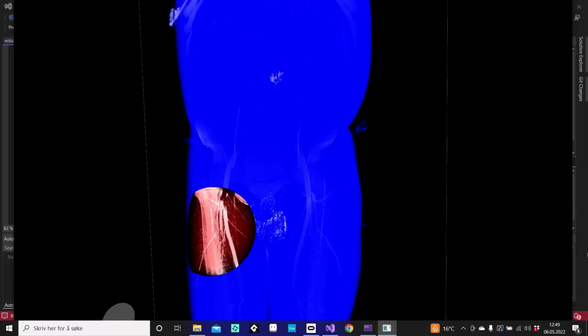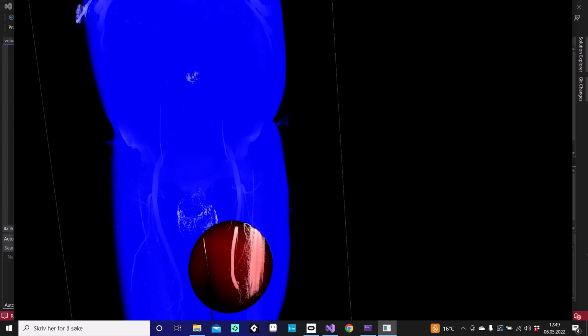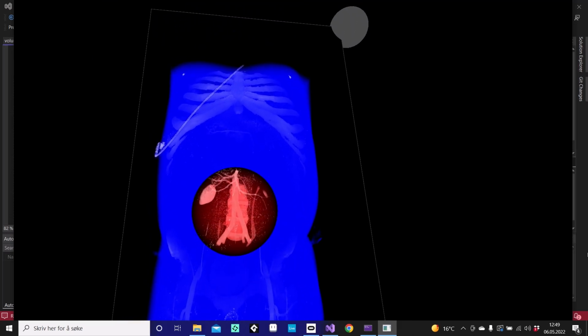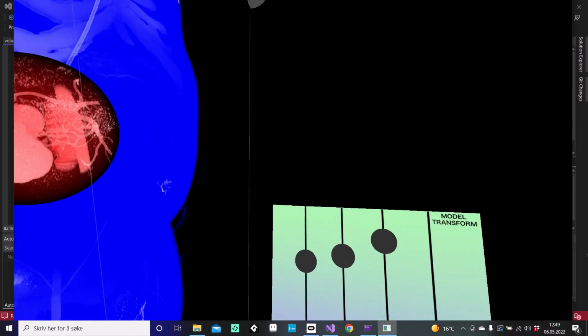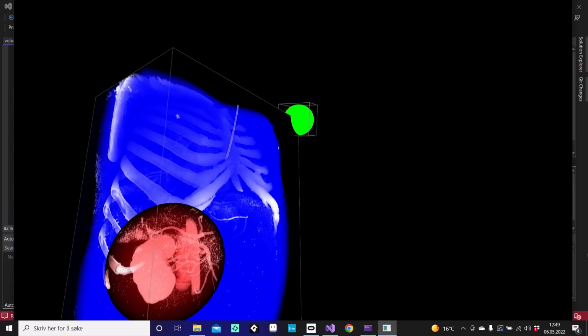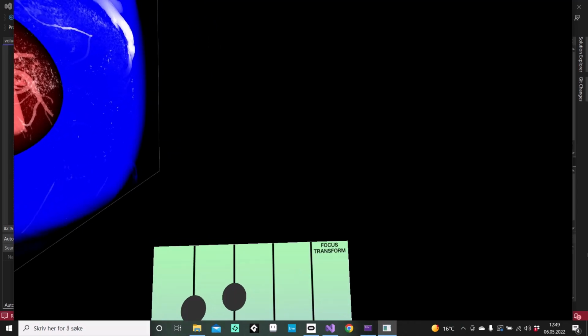The focus is very intuitive to move around spatially in extended reality. The alternative is to use a traditional two-dimensional user interface or keyboard and mouse, but this is much more fiddly and not as fast. I also think feel is important, and for moving objects around in a three-dimensional space, not much beats moving your hands around freely.